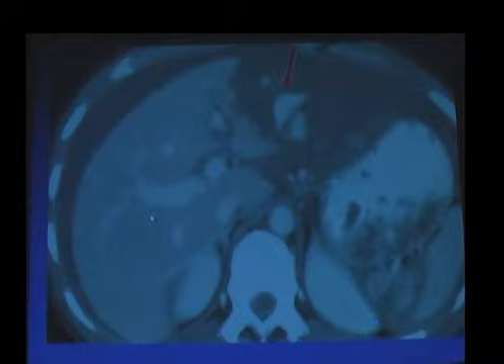splenic lacerations, but in addition he has this area of active arterial bleeding, and when you look at the left lobe of the liver you can see this jagged edge, you can see the large amount of hemoperitoneum here. As we scanned more inferiorly, what you can see is this is actually the avulsed piece of his lateral left lobe all the way down into the pelvis, again with a large amount of hemoperitoneum.